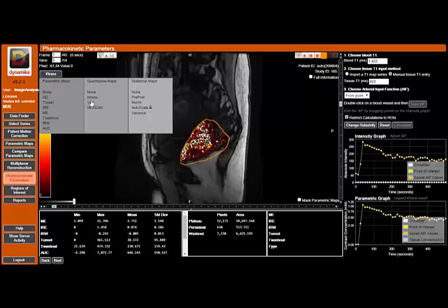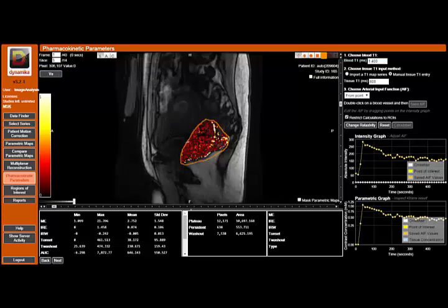We also calculate the volume of extracellular space in the region. So this is the interstitial space between cells. Again, this could be indicative of inflammation. There's a lot of fluid in between the cells, or if it's a very high value, it could actually be indicative that it's water. In fact, just over here, although we don't really show it, would be the bladder, and that would appear as a very high volume of VE because there's basically no cells there. It's just water.